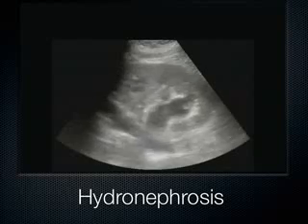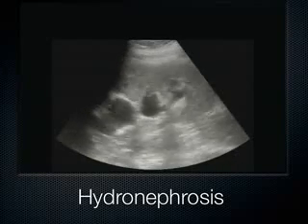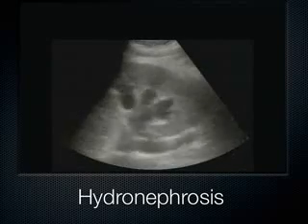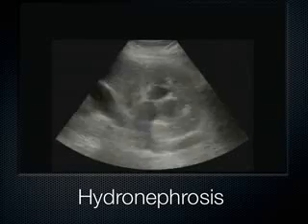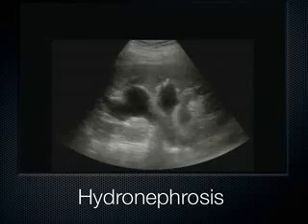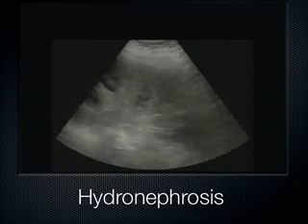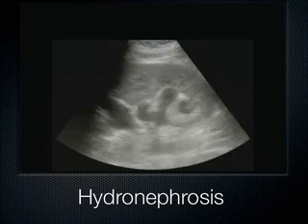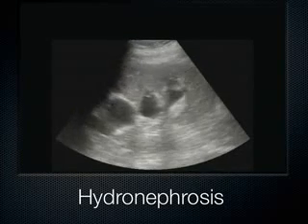But you move on, you see a little bit more. We can see the fingers of the glove kind of going out into these different projections. They eventually all coalesce, but not until we get right at the renal sinus does it coalesce down here. So that's another bit of, I would say, mild amount of hydronephrosis. It's a very nebulous grading category, but here it's sort of splaying out a little bit, sort of mild. We can still make out plenty of cortex. This is all cortex out here. There's plenty of cortex left in that kidney.